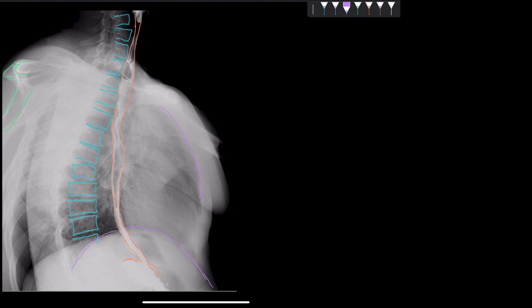So that is one of the constriction sites seen in the pathway of this esophagus. When we are coming down, we can see certain narrowings which are very easily visible, and there we can see a very clear narrowing in this location.